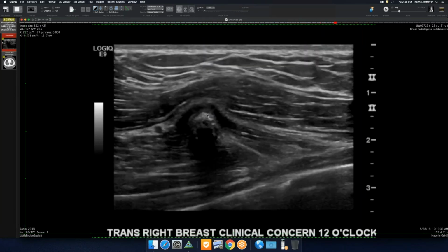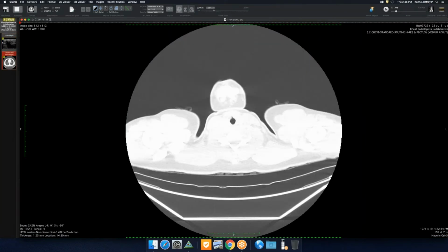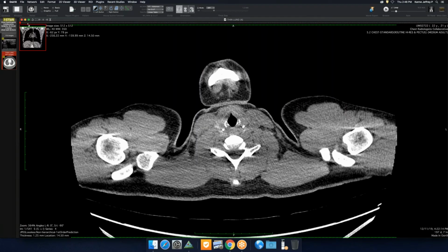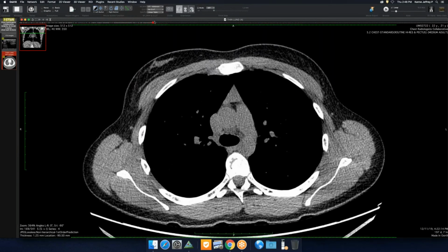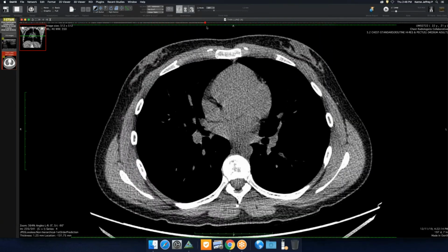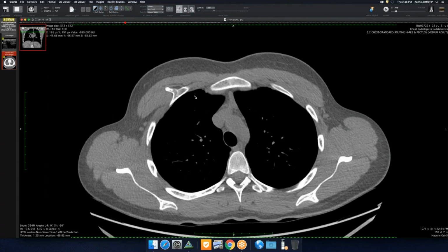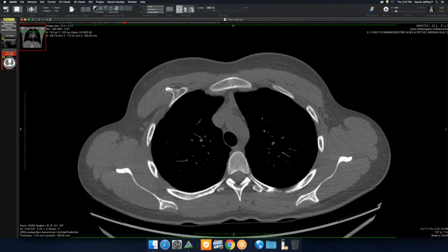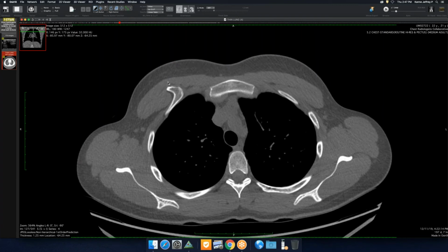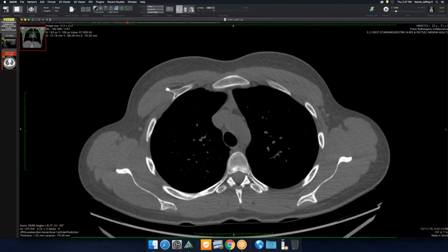So at this point, they recommended getting a CT for a chest wall lesion, as opposed to doing a mammogram, appropriately so. There's a nice ultrasound. And you can see she's fairly muscular, and what we end up seeing right at 12 o'clock, right here, is a very nice example of an osteochondroma. It's got the common marrow space, intact, contiguous cortex, not much tissue around it, but you can see it's indenting on her pectoralis and would be a fairly firm but palpable lesion there.